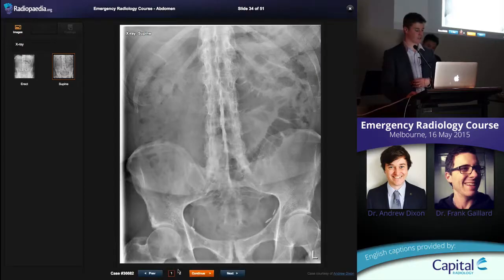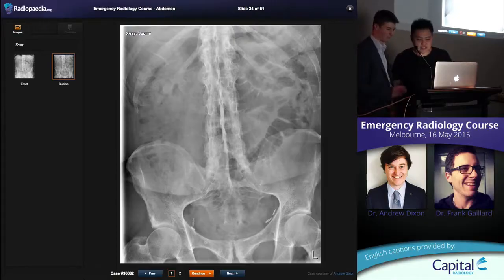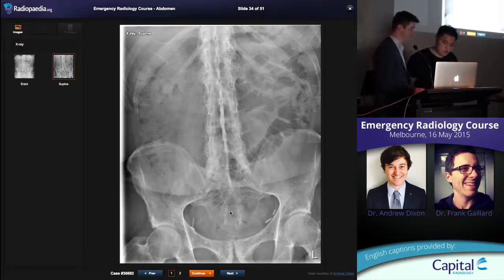So Daniel spotted all those things, and Daniel spotted the transition point on the CT, but he also spotted the other background disease that this patient has, which is? Ankylosing spondylitis. Yeah. And so you can see it in the dagger spine appearance, that's calcified interspinous ligaments. Correct. The supraspinous and interspinous ligaments ossify in ankylosing spondylitis, creating that dagger sign, and also the bamboo spine of the syndesmophytes fusing, and you can't see the sacroiliac joints, completely fused. So that was just a nice multiple findings kind of study. I'm going to move on. Take your prize, Daniel.